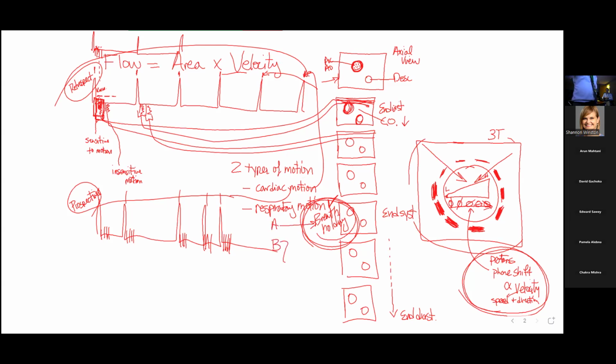B is something we didn't talk about last week, and that is respiratory triggering. What in the world are we talking about here? Well, on the backdrop of these nice QRS complexes, and here we're going through our AFib example, you can also do one of several things.